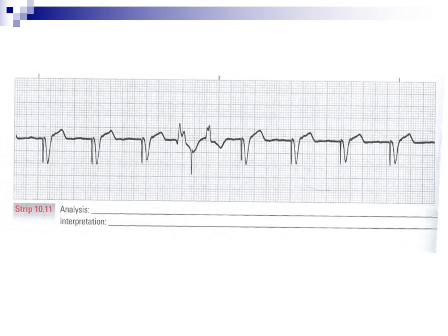In 10.11, you have a pacer QRS, pacer QRS, pacer QRS, and then you have 2 of the patient's own beats, but you have a pacer spike here. There's no QRS that it induced, this is the patient's own, but it's hanging out there and it didn't capture, which is a good thing. And then you continue with pacer QRS, pacer QRS, pacer QRS. So what does that mean? That means this patient's own rhythm kicked in, but the pacer did not sense the patient's own beat, so it should not have fired here. Thank goodness it didn't capture, because that could have thrown that patient into V-fib.